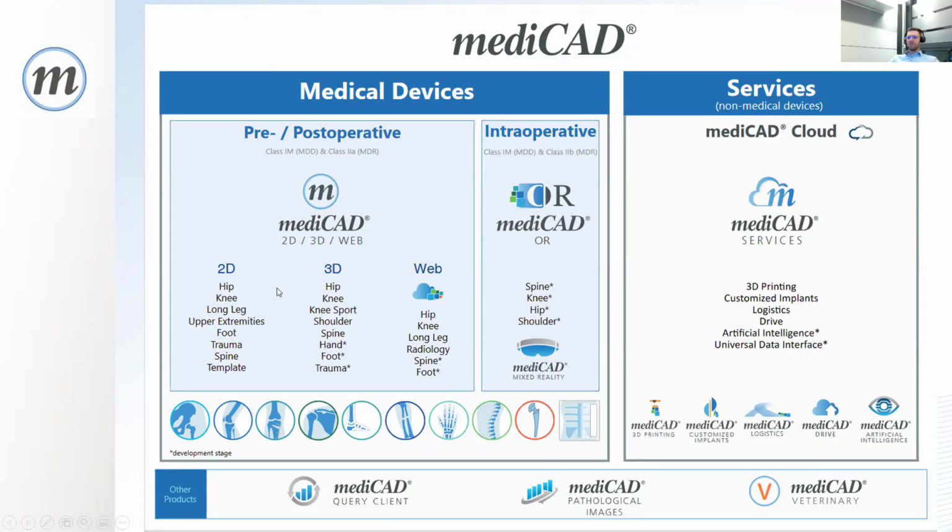And today, as I mentioned before, we will go deeper into the spine module, and there are the 2D and the 3D possibilities. Of course, treating or caring for a patient is not only done with the preoperative planning and the surgery. We are also working on solutions where you can take the preoperative planning and the data you created into the operating room.